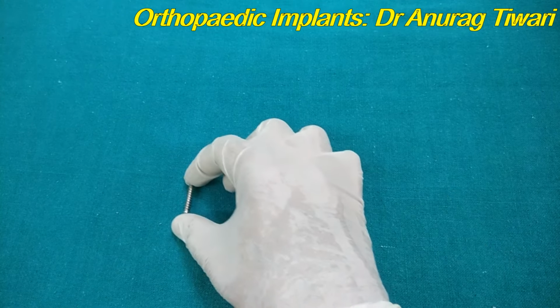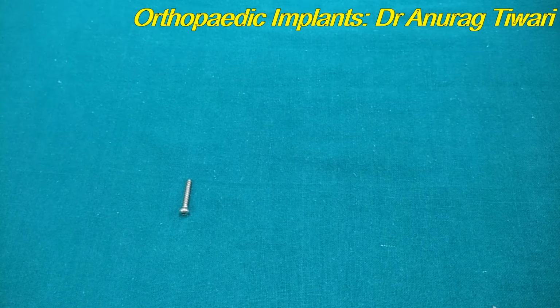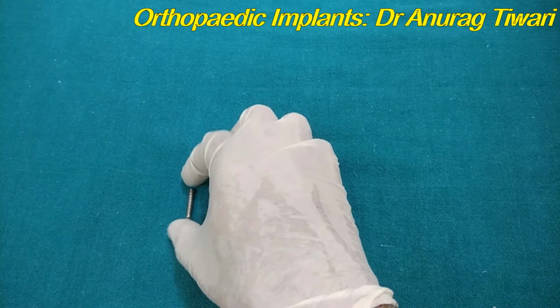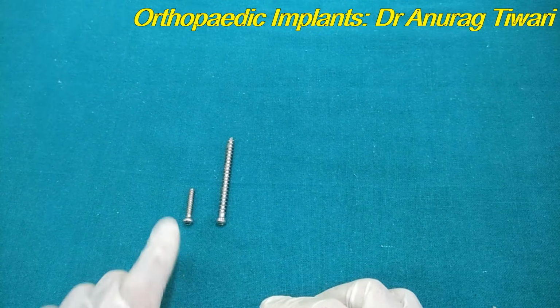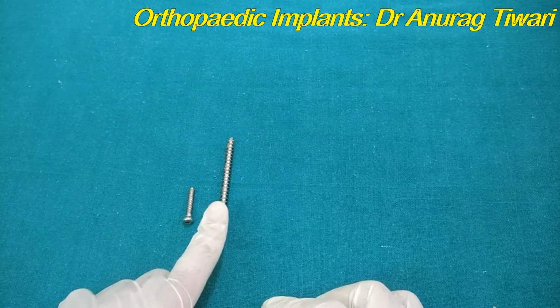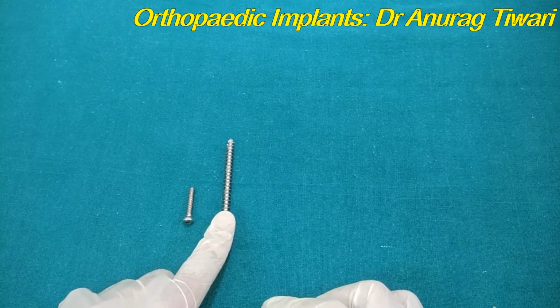Now we will discuss the different types of screws. There are various classifications into which the screws have been divided. One is the cortical and the cancellous. So this one is the cortical screw, which is used for cortical bone fixation. This one is the cancellous screw, which is used for cancellous bone fixation.